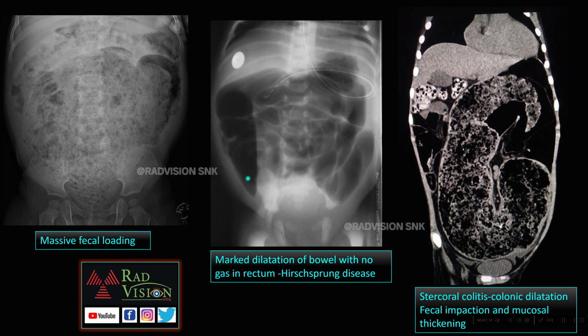chronic constipation. Here also this other child presented with abdominal pain, abdominal distension and constipation. Here you can see there is marked dilatation of the bowel and there is no gas in the rectum. So whenever there is marked dilatation of the bowel with no gas in the rectum in a child, definitely suspect Hirschsprung's disease.